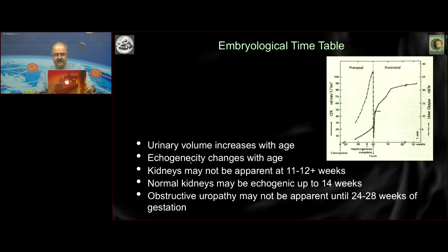Again, like I said before, kidneys may not be apparent all the way up to the 12-week scan. And even at the 12-week scan, you may not see 10 to 20% of the kidneys.